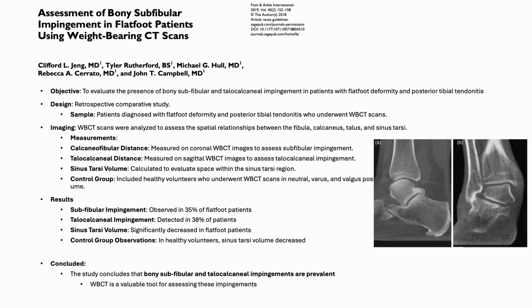I also will go back and highlight this second image. You can see their orientation, that valgus orientation of the calcaneus compared to the weight-bearing surface of the tibia. It's totally in valgus, which means that the foot is really collapsing. They're getting a lot of hindfoot pronation on that B image.